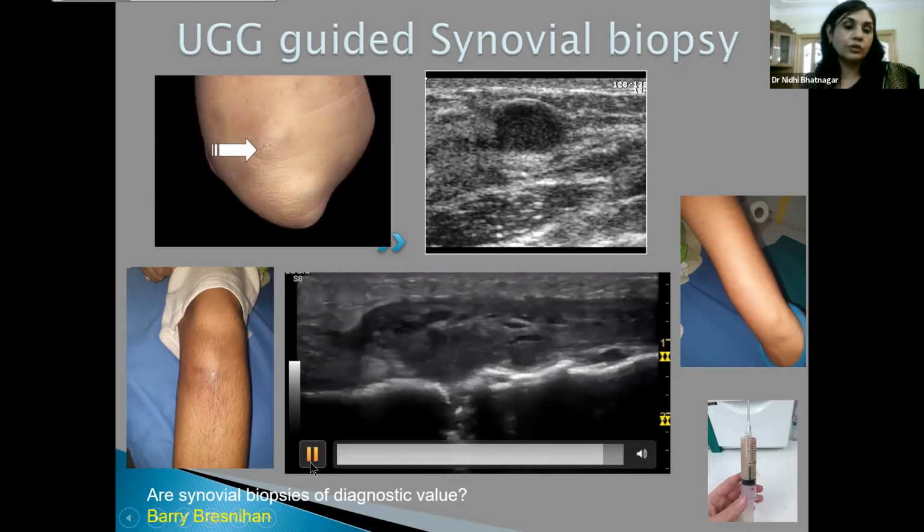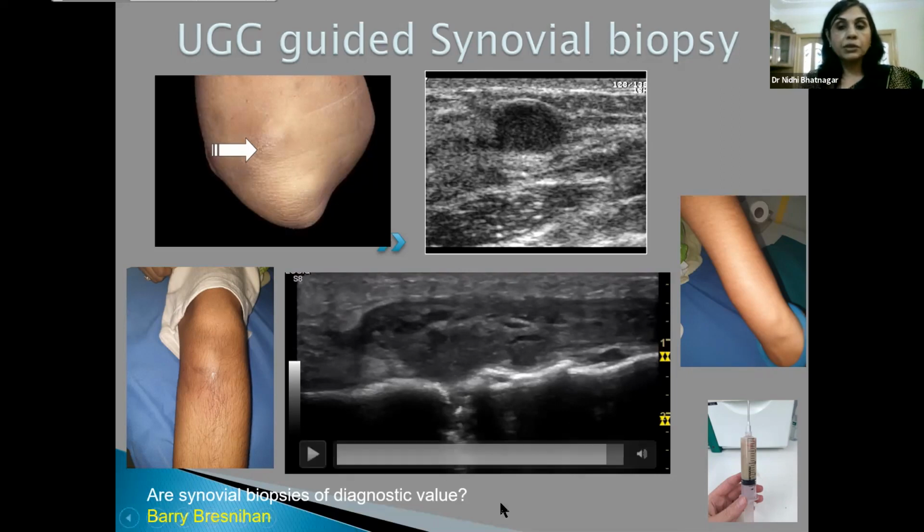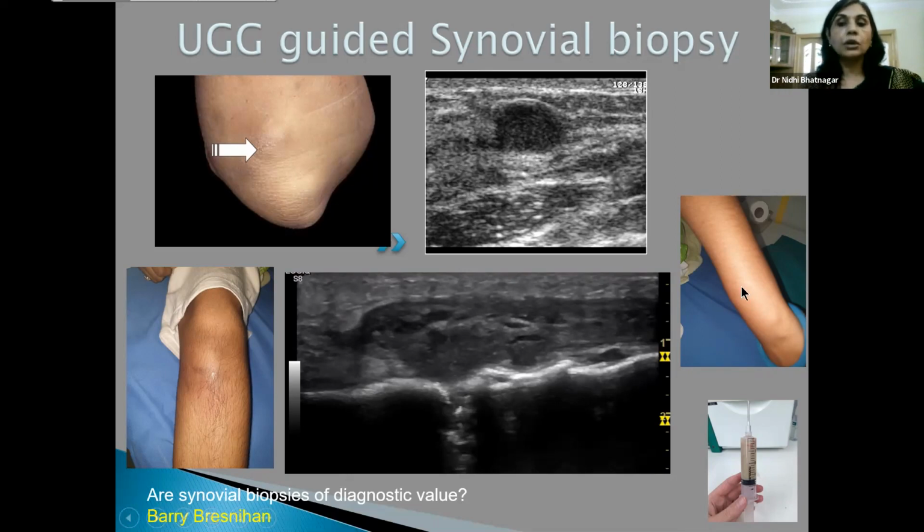On our ultrasound, this patient was put on empirical antitubercular treatment, as you can understand. After this, for 4 months, she took ATD and she came back to us again. This time on the forearm, she had this sort of swelling. When we aspirated, we sent it for inflammatory markers as well, and we found that she was positive for rheumatoid arthritis.